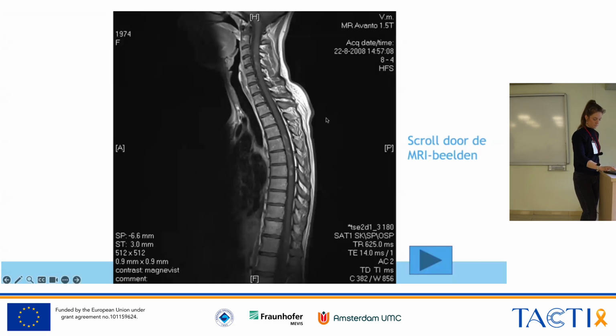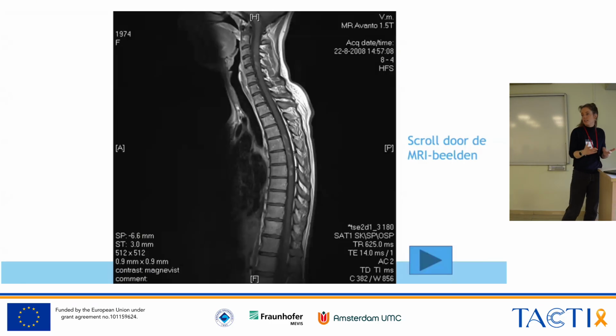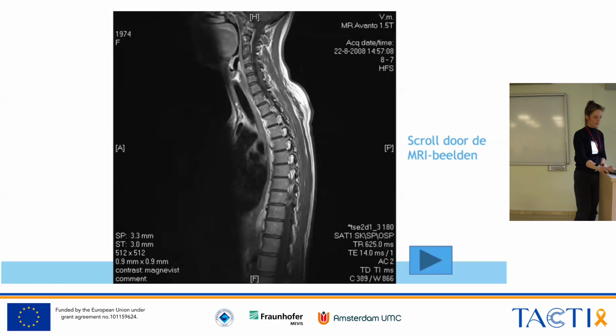We're not debating about it, but just from the imaging aspect, it sometimes can also look like something else, like one of the cousins. Yeah. Sometimes the spinal cord can be so severely affected that you don't see the differences between the lesions anymore, and it looks like one long inflammatory lesion.